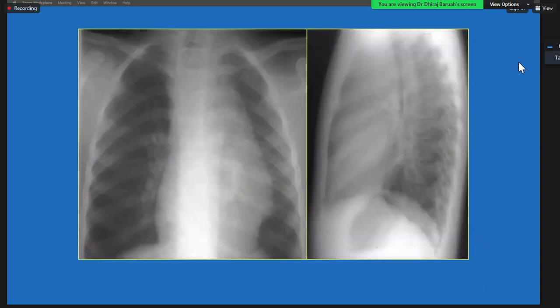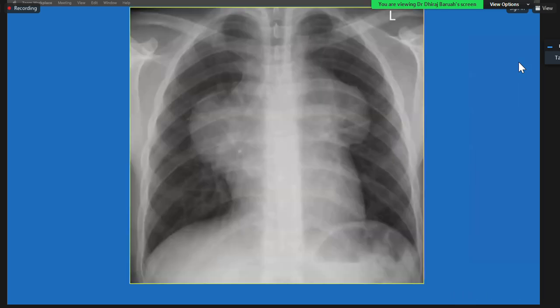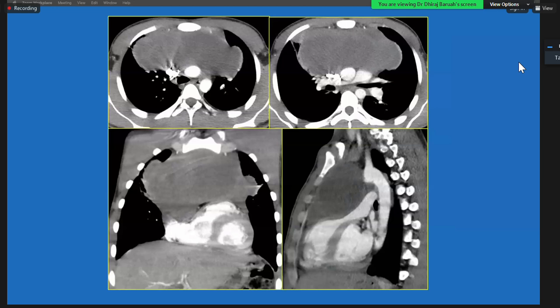So look at this lesion out here. This is on the left side of the mediastinum. You do not see the heart border in that location, and you see the pulmonary artery. So this is also in the anterior mediastinum. So if you look at this lesion out here, bubbly lesions overlying both hila, and you do not see the cardiac margin in those areas, but you see the pulmonary arteries. So this will have to be in the anterior mediastinum.